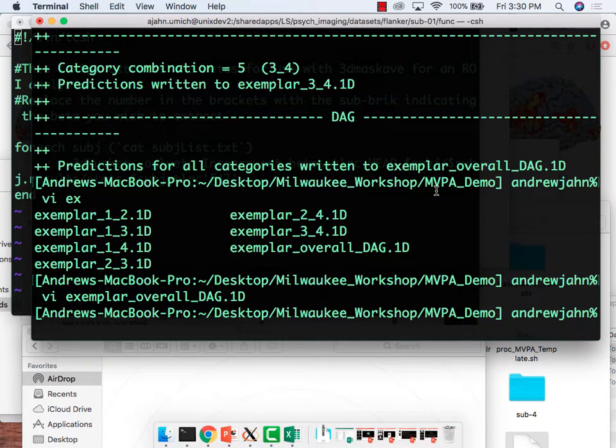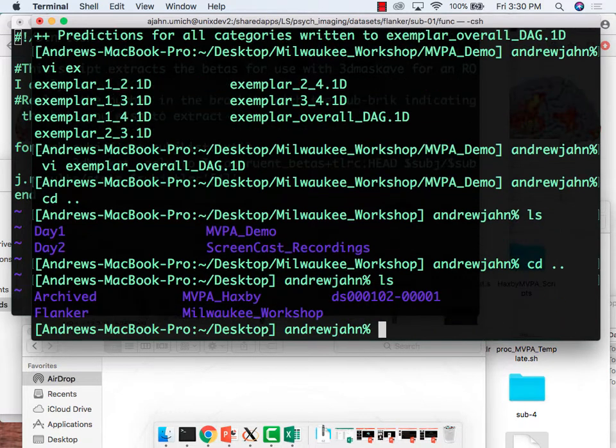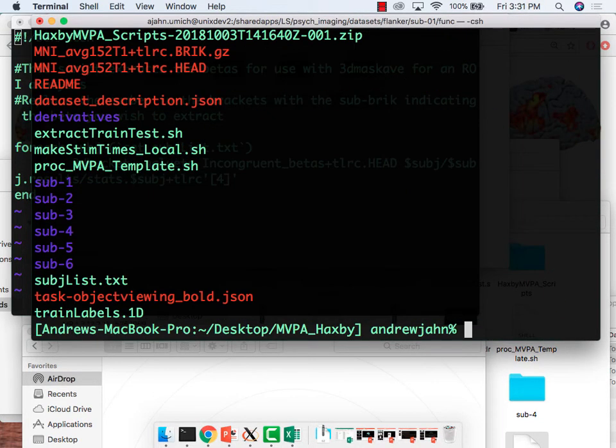And we are going to try to end at 4:30. So come hell or high water, when 4:30 rolls around, we're just going to leave, if people are okay with it. Or I'm going to leave. You can stay here. Sound good? Yes. All right. Just make sure you're logged in, make sure it doesn't log out at any point, make sure AFNI is working, and let me find my MVPA directory.